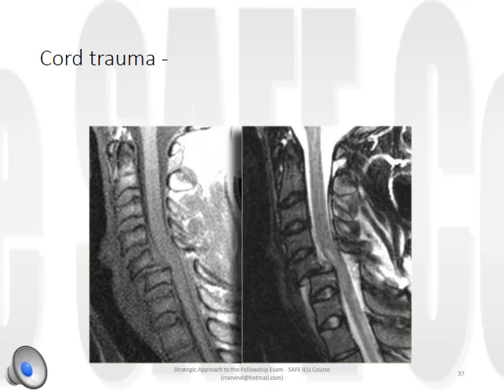So here we've got the T1 image on the left and the T2 image on the right, because on the left the CSF is dark and on the right it's light. You can see that at C5, C6, if we're looking at the posterior line, there's significant disruption. There's a dislocation with 50% anterior position of C5 on C6, a very unstable injury.